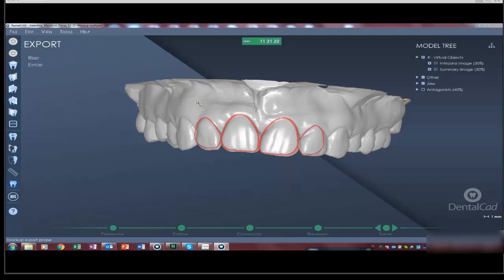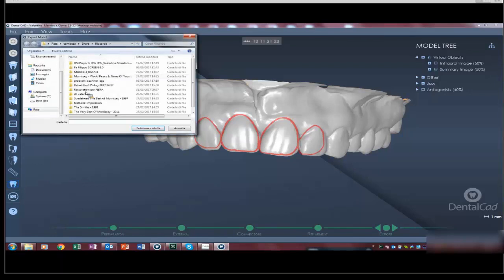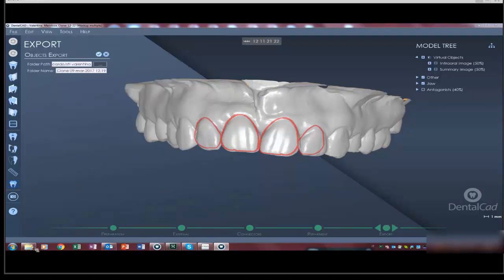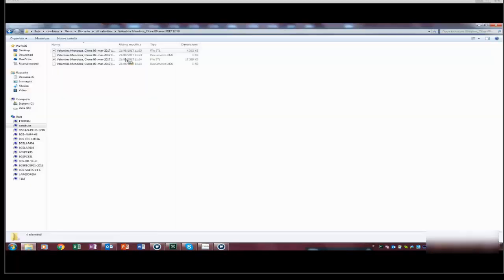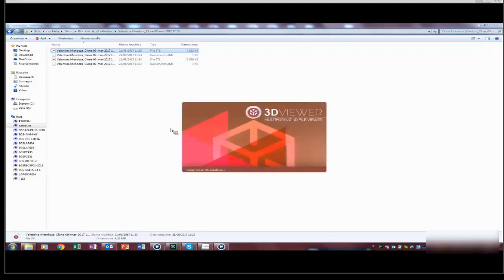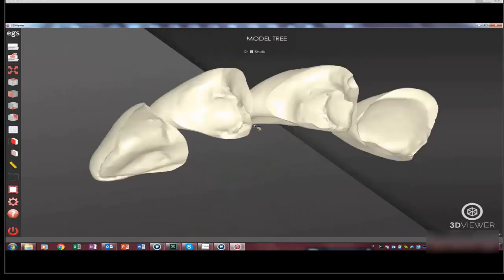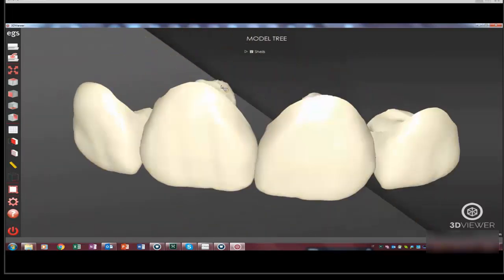Okay, export. We save it in, I don't know, for example, create year. Okay. So the first one, the lighter one, is obviously this one. Okay. And the other one is this, which is much heavier, of course.